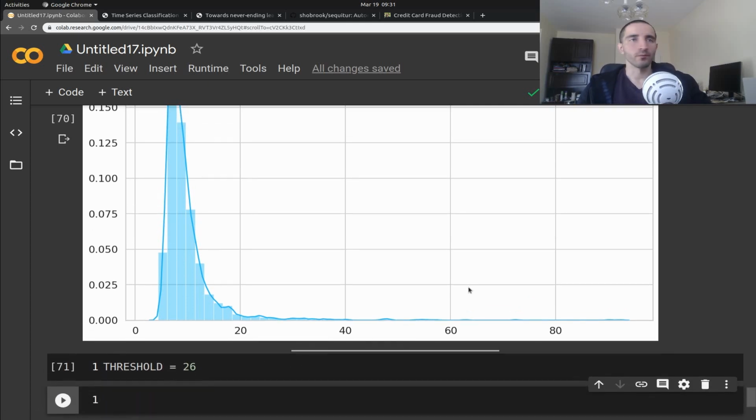Okay, so based on this threshold, we are going to take an example time series data and input it into our autoencoder, and we are going to record the loss. If the loss is above this threshold, we are going to classify the heartbeat as an anomaly.